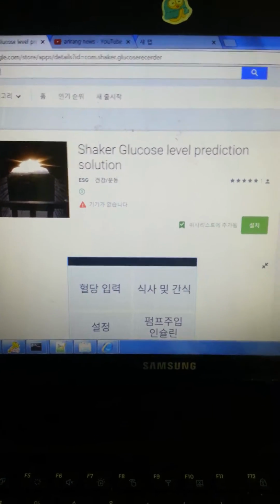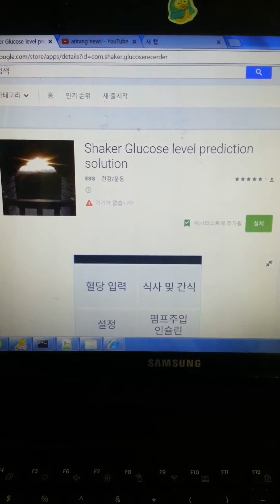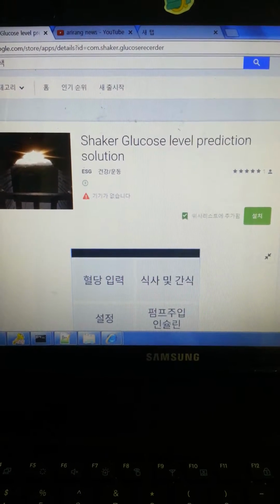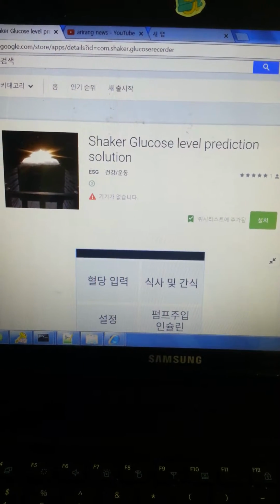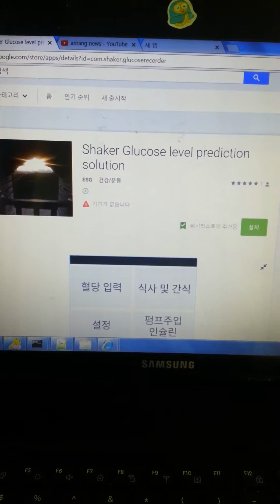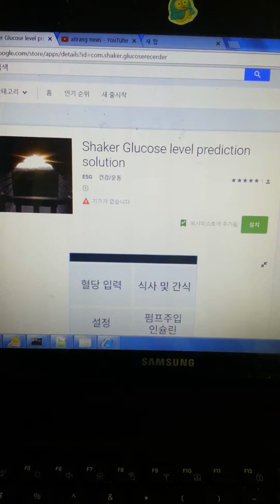I want to introduce my program for diabetic patients. I developed this program for 1.5 years, and finally I released it on Google Market. Now you are seeing my program on the Google Market. Let's see what its features are.